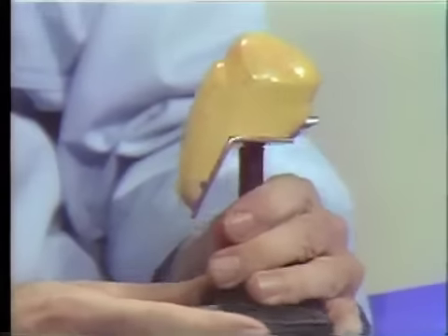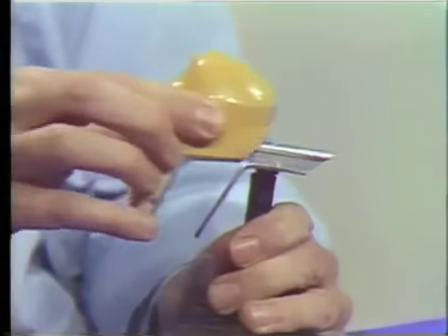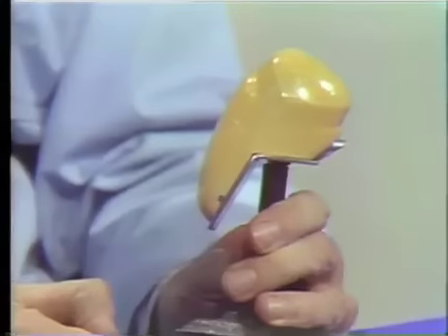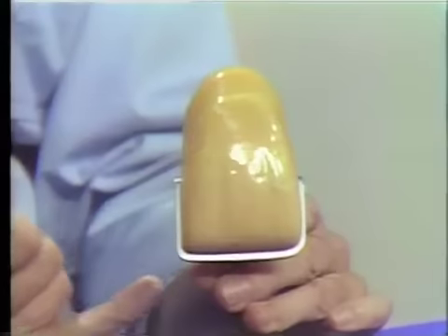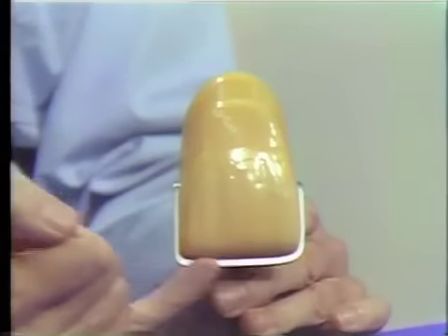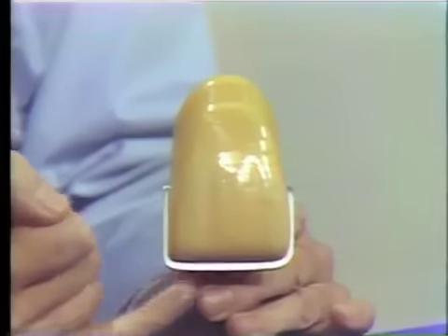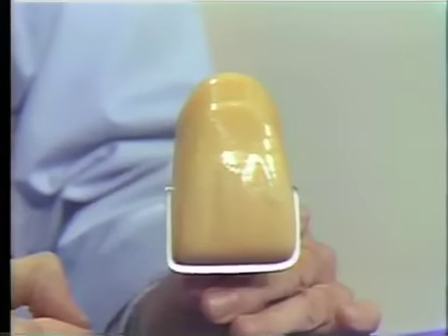Here is another enlarged model of a similar type of Pontic, but this is for the anterior teeth, and this is the facing which slides on and off the backing, as you see there. This lingual surface would be waxed in here and would give rise to connectors on either side and so on. No incisal protection can be developed for this type of anterior Pontic, so the same sort of edging is developed here as for the Steele's flatback situation.